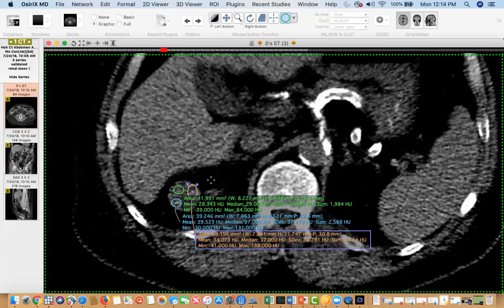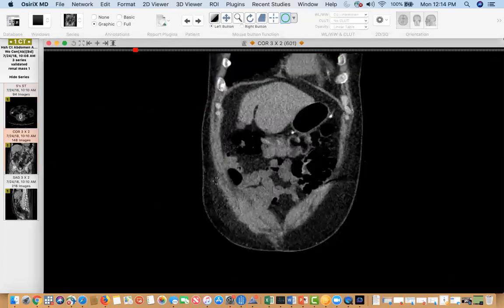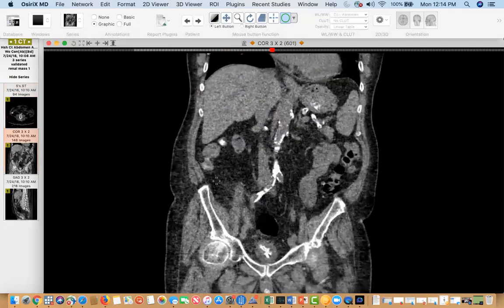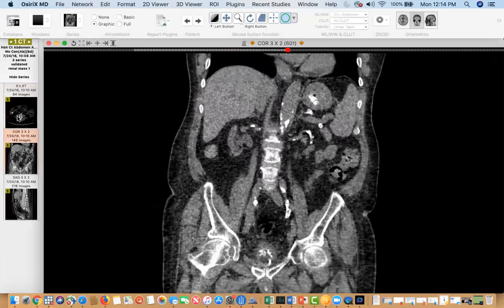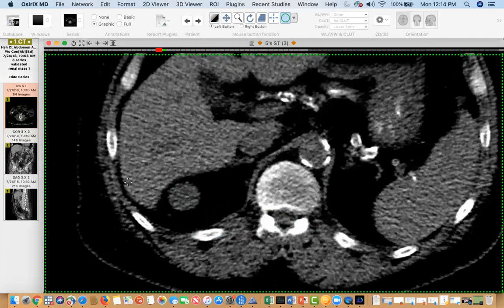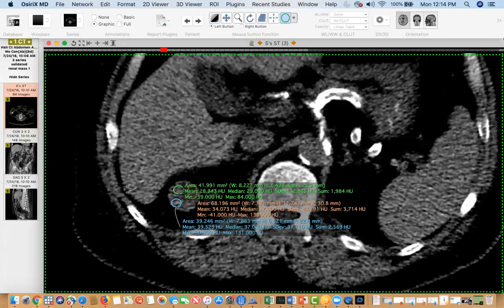But I think the newer approach now is to look at the heterogeneity as well, because you can have areas that are cystic and others that are solid. So, at least based on the SAR presentation from Matt Davenport, who chairs the RCC committee, we want to look at the heterogeneity on the non-con, because even if it measures less than 20, it can still be a mass.